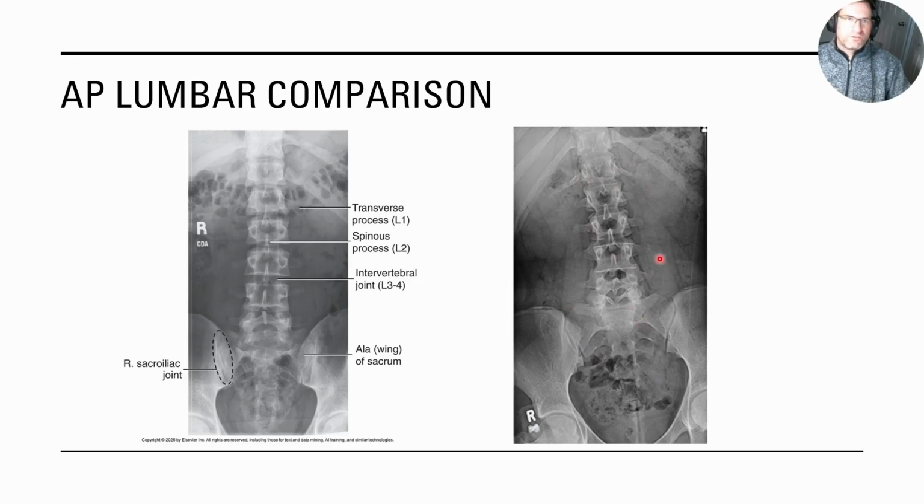But when we compare the contrast and definition between one and the other, there's a lot going on. You can see the psoas muscles and some of the other anatomy that really isn't needed. Also, we're almost down to symphysis pubis. Like I said, it could have been collimated a lot better to get a little bit better definition like we have on the left side.